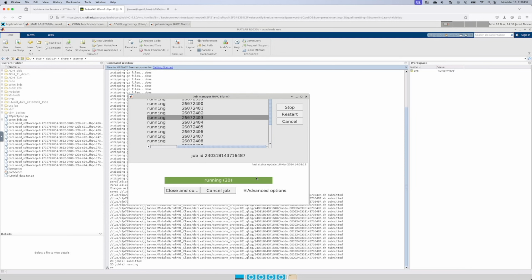If you're getting errors, it's very possible that there were typos or you did something not quite right. That's the learning process. But there are other things that will happen if you're using a different data set or whatever. There are a lot of things that can cause problems, and it can take a while to troubleshoot, but hopefully everything goes smoothly, and this will take time.